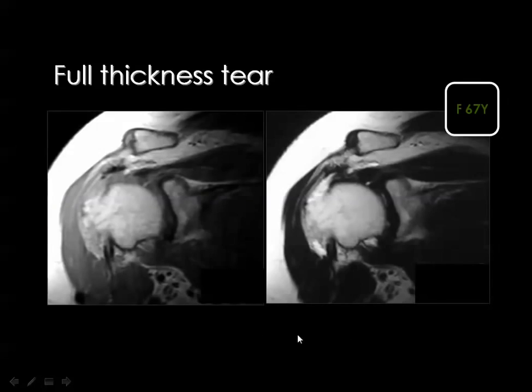Then this is the full thickness tear. You can see the cut edge of the tendon. Here is the cut edge of the tendon, and this is the gap to the greater tuberosity. The gap is about 2 centimeters, and the muscle is more or less intact.